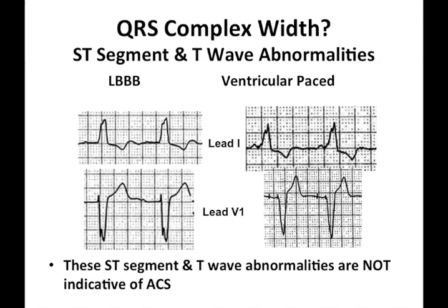A close-up basically of these two patterns demonstrating both the widened QRS complex and the ST depression and ST elevation typical of left bundle branch block pattern as well as ventricular pace pattern. These ST segment and T wave changes do not represent acute coronary syndrome.